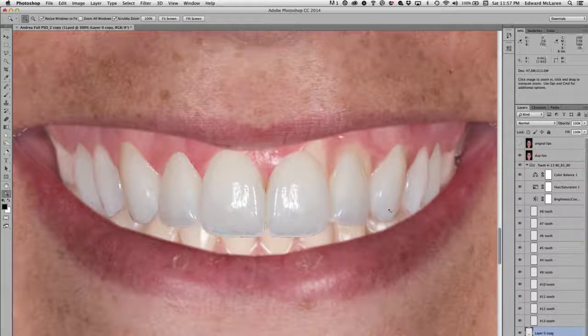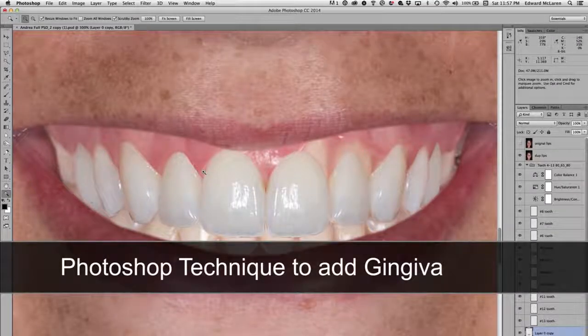Like, let's say this is a preoperative situation where we put the teeth now where we wanted to, and we could see now we'd like the gingiva, but now we've got a problem. We don't have enough gingiva over here. Previously, we were going to take away gingiva. Well, how would we do that? So I actually did that digitally just to show you something.